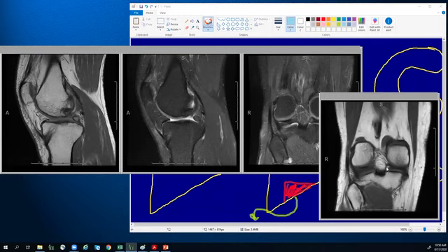And also not to get confused on the MRI by using your T1 sequences to convince yourself that you're looking at bone. And there was a very nice paper from Thomas Jefferson University where they found the strong occurrence of these with people who have had previous posterior root tears. So most likely there is some element of trauma which leads to the formation of these ossicles.